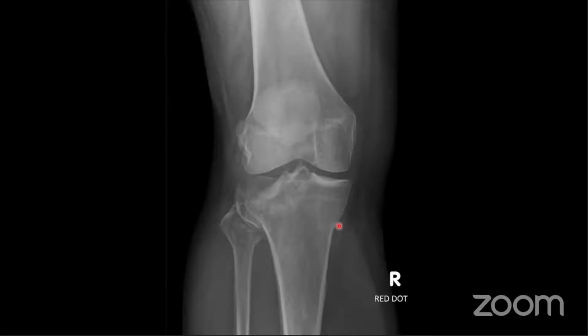Right, okay, so we've got a few answers in. So someone said osteophytes. There are osteophytes, but that's not the primary finding. So the history is fall, knee pain. Yep, tibial plateau fracture, depressed tibial plateau. Good, okay. So this is the abnormality. So this is a fracture of the lateral tibial plateau.